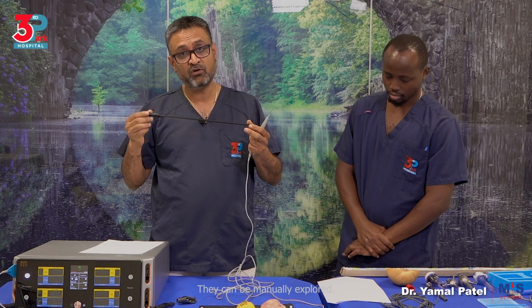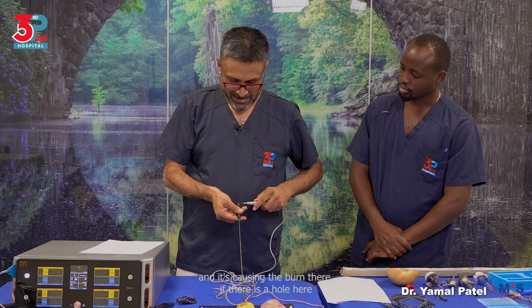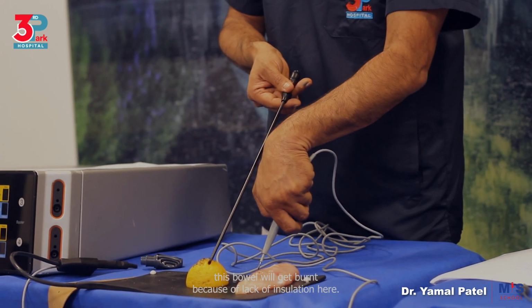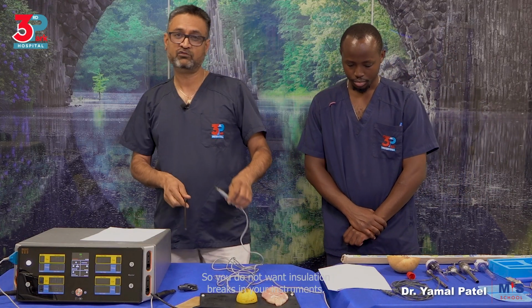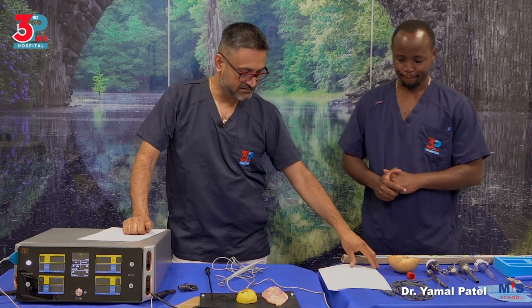They can be manually explored. It's not the most accurate way, and there are techniques and instruments that can be used to explore this instrument to see that there is no break. Because when there is a break, if I'm activating it here and it's causing the burn there, if there is a hole here and bowel is touching here, this bowel will get burnt because of lack of insulation here. So it burns here where you want it, but it burns also here where you don't want it. So you do not want insulation breaks in your instruments. So regular inspection of the instruments is extremely important to avoid insulation failure risk.